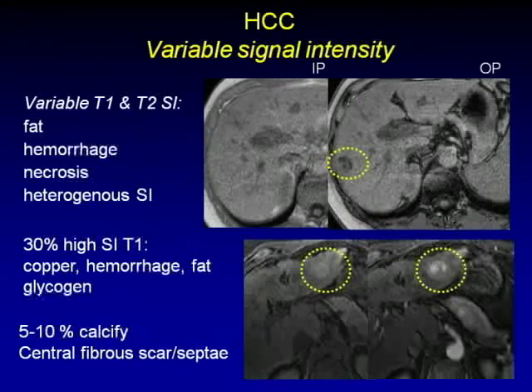So a focal lesion in the liver, at least 2 centimeters in size or approximating 2 centimeters in size, you're going to think of hepatoma. Any lesion that's bright on T2 and focal, you're going to call hepatoma. Any lesion that's hypervascular and approximating 2 centimeters, you're going to call hepatoma. If it falls under the 2 centimeters and it's not bright on T2, but you think it's focal, but it's small, it could be a hepatoma, it could be a dysplastic nodule, it could be a shunt.